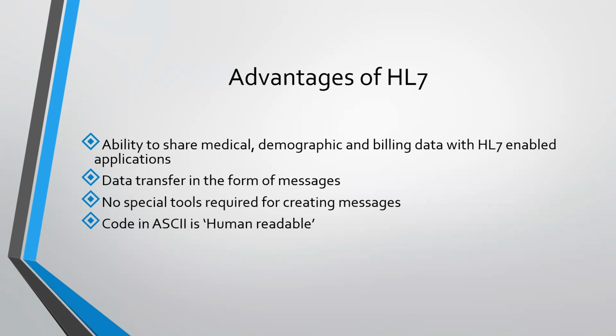Okay, and then the code is in the ASCII format, which is human readable, which means whoever can read English can understand HL7. Even if you don't know the structure, if you take a deeper look at it, I am sure you'll be able to identify a few of the elements of the HL7 message structure. And then it can work on any OS. This is the wonderful feature that we have, because it operates on the application layer, which is common for all the operating systems. It can work on any OS, so there is no restriction there.